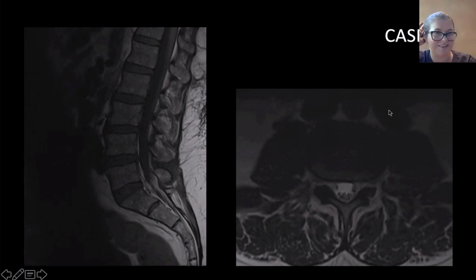I remember doing this and thinking, what the heck are these? Are these like black lymph nodes? I've never seen lymph nodes so dark. And because I went to the patient's jacket and looked at their previous CT, I saw that he had cirrhosis, and these are actually huge varices.